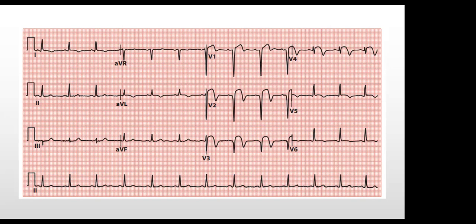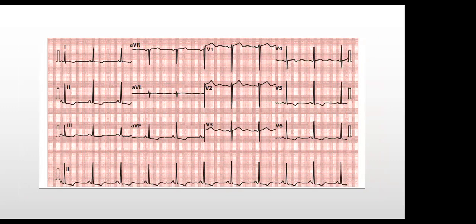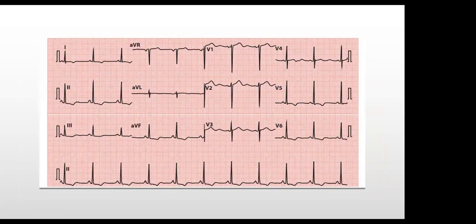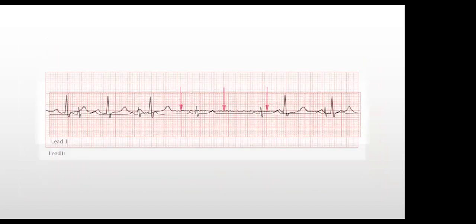So it could suggest to you that the proximal part of the LAD may be involved, in terms of trying to categorize the coronary artery that is involved. So these are still T-wave inversion. Just trying to tell you that T-wave inversion might be there.